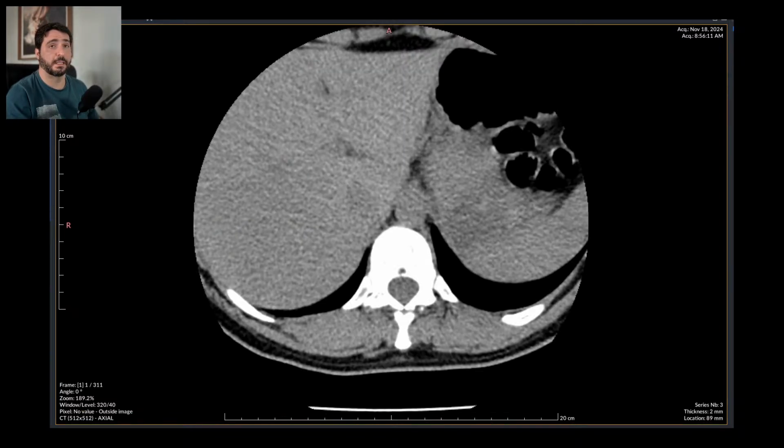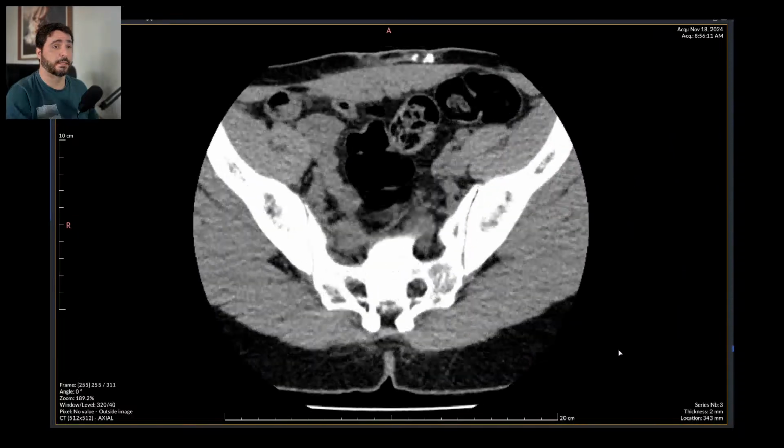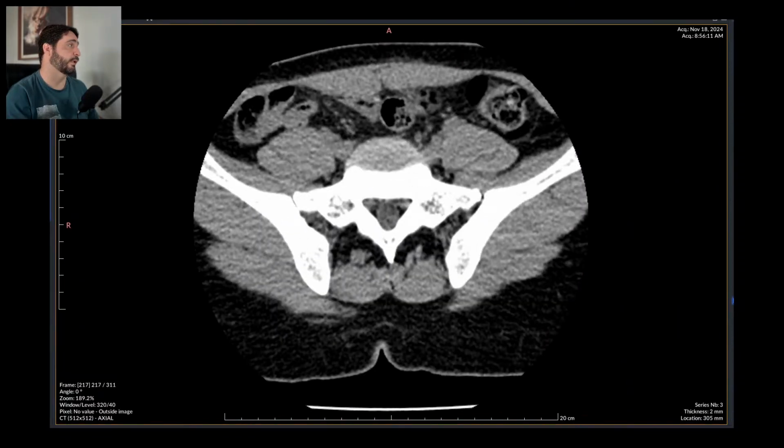It's just like I imagined. They didn't send any dorsal spine images, just lumbar spine. Just going to send it back so they can send a proper package of dorsal spine exam.